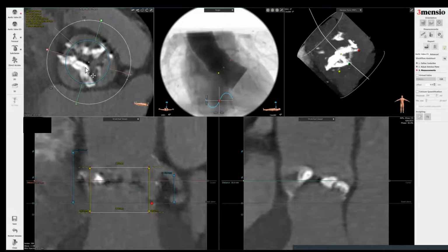You can see this particular patient has a big chunk of non-coronary cusp calcium, that's all going to go outside the circle. Same thing here. So if you have a very small sinus, this could risk injury, or the valve may be underexpanded because it can't push this calcium leaflet out towards the sinuses.